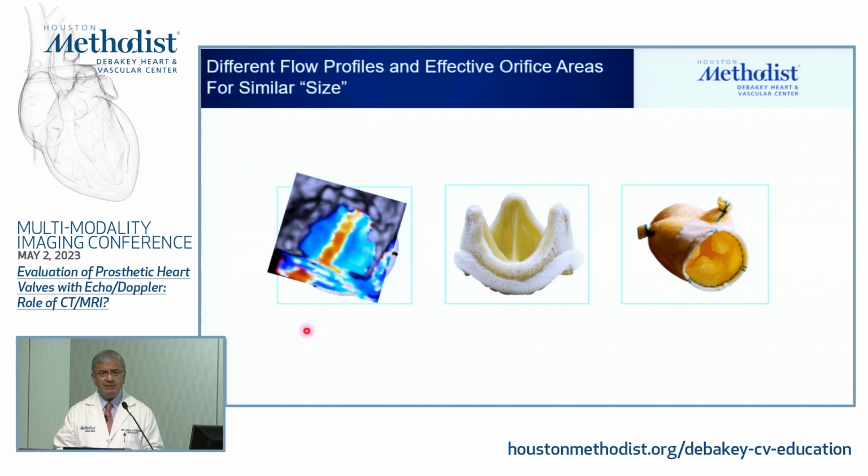Now, when you interrogate with Doppler, since most of these are from the apical window, it is very difficult to differentiate between them. The only time you may see a difference is for a prosthetic mitral valve using a transesophageal echocardiogram. If you put the cursor between them, the velocity is a bit higher as opposed to the larger orifices. In the others, we don't have an overestimation of velocities and gradients. So in a small valve, and small is 21 millimeters or below, certainly a 19 millimeter valve, there will be an overestimation of the actual gradient compared to hemodynamic assessment.